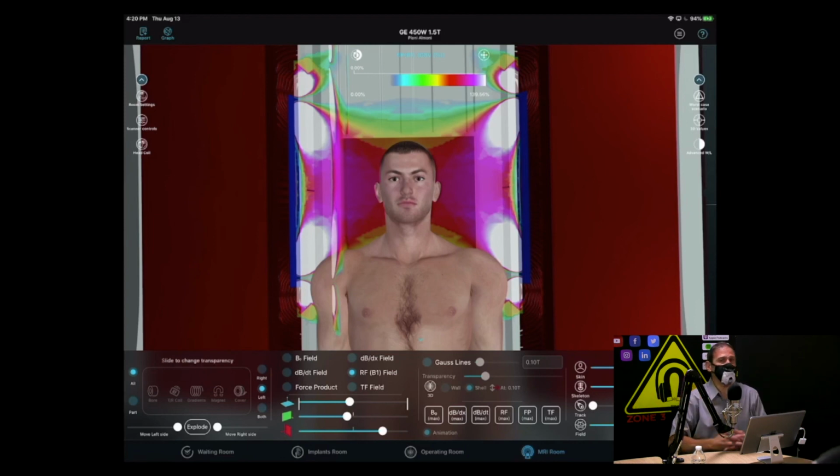And that's why they're the ones that experience those type, I call them proximity burns. They experience that more frequently. In fact, since the app, again, once it's in a computer, it doesn't let you leave out steps. So as soon as you enter gender, height, weight, and you pick a scanner, it will automatically warn you. Our calculations suggest that this patient may be at a higher risk for a proximity burn. Be extra careful about padding this patient.